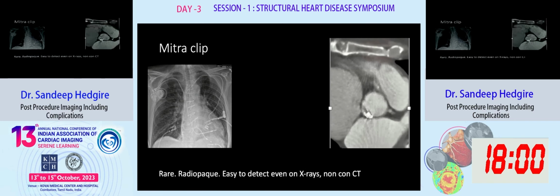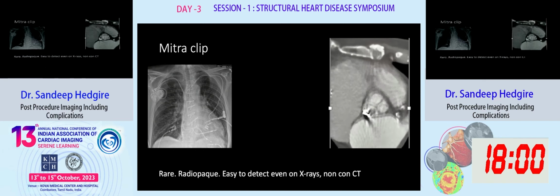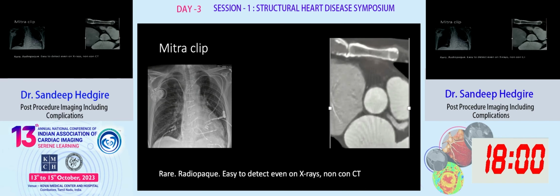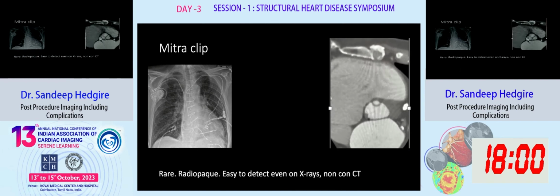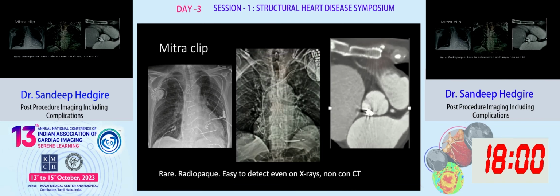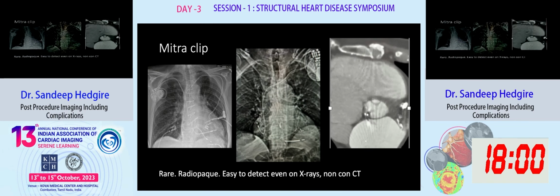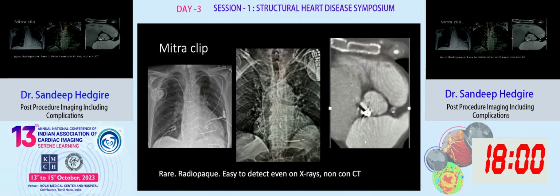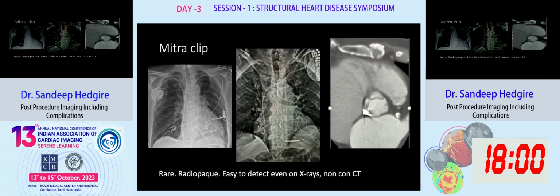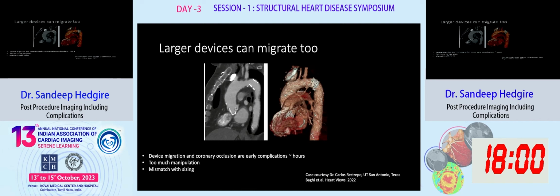Non-contrast CT is good to see where the device is, but sometimes for precise identification, you need contrast on board, and this is an example of that. Mitral clip migration is thought to be rare. Here are two X-ray examples of how a migrated device can look very different on X-rays, but not only smaller devices migrate, larger devices can migrate too.